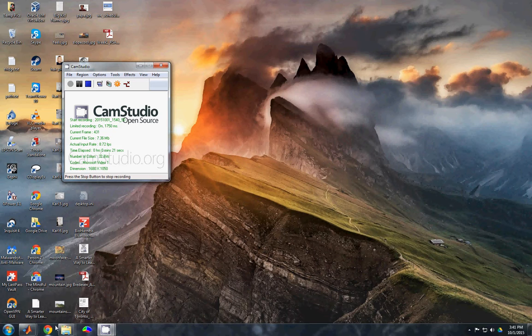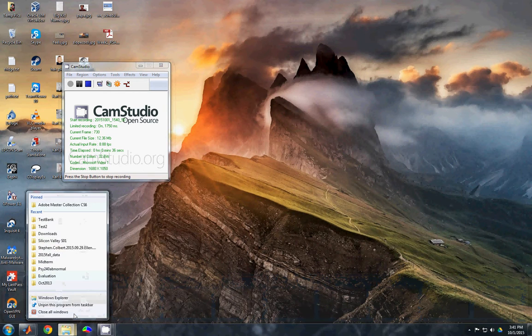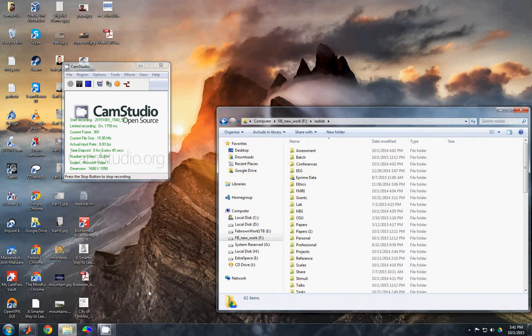First up is to check out all the things you're going to need to get started. The first thing you will need is a sample brain image that I hopefully sent you by now, or you have a link to. Those will usually come in a nifty format, which has a .nii extension. In this case, I'll show you where I have it on my hard drive here.